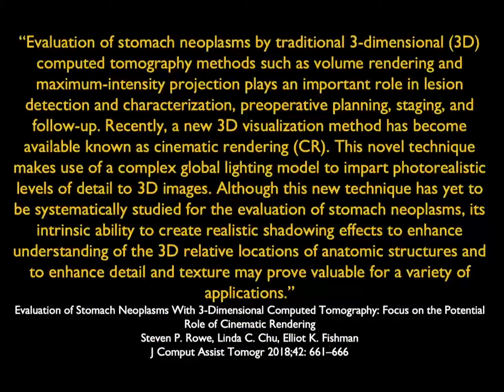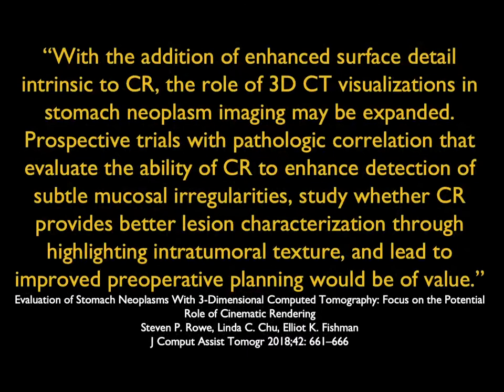Now, we did publish an article about this, talking about the value of 3D imaging, how it potentially can be used for not only staging tumors, but for early tumor detection. With the addition of enhanced surface detail, the role of 3D visualizations in gastric cancer may be expanded. Prospective trials will be necessary, but you can see where we're going.